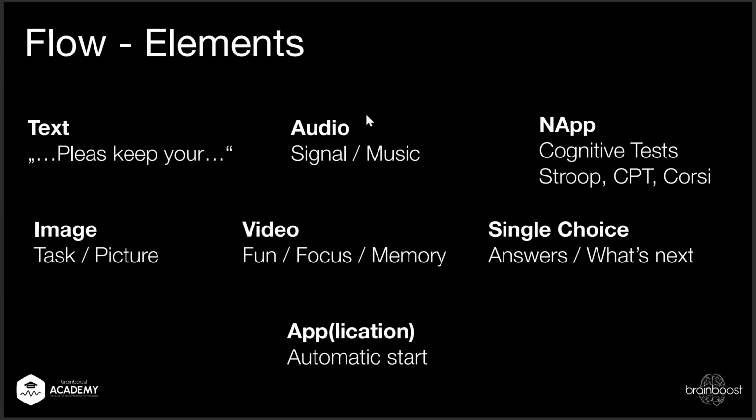So you can implement in your own flow a music file where you say, okay, listen to this 3-minute meditation file. While this plays, you can do an EEG recording, and then afterwards you can also say, okay, how was the brain behaving while listening to that music, afterwards, before, etc. You can implement those nested applications.